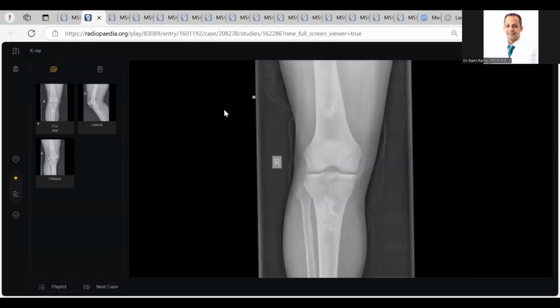Then this case. This case also is a classic, and you did very well. This is a bone infarction in old age. We should ask for the different histories. Lower femur and upper tibial serpiginous sclerosis, which denotes most probably bone infarction. And then you enumerated the different causes. I ask to give you a higher mark.